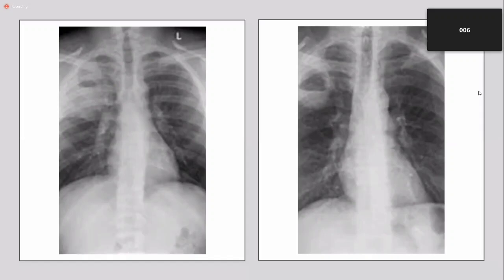It's a lobar pneumonia, but you can see the air above there, right? Apex air, that means the entire upper lobe is not involved. Parts of the upper lobe are involved. The right upper lobe pneumonia, and then there's a cavity with a fluid level inside. Fluid is due to pus in the abscess, right? So this characteristic air-fluid level, rounded shadow, right? In this one there is no consolidation, but in this one there's a consolidation. So this was secondary to a pneumonia, right?